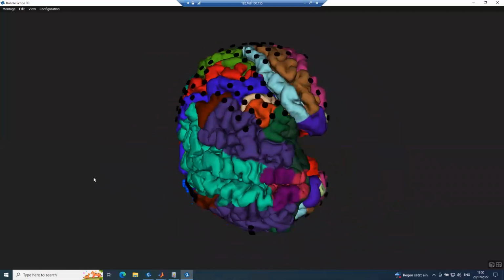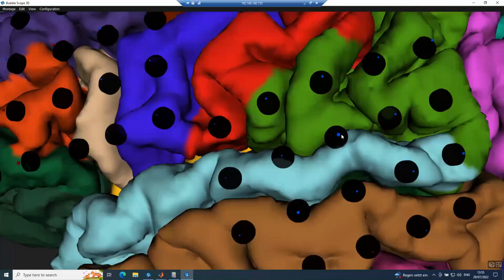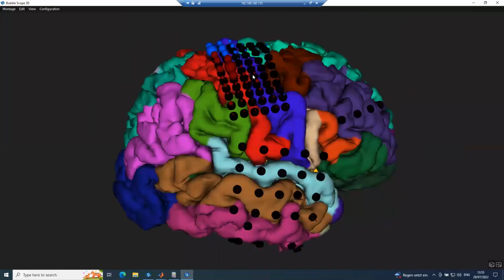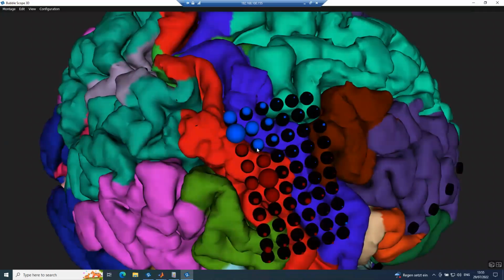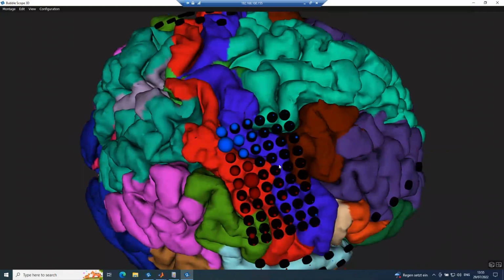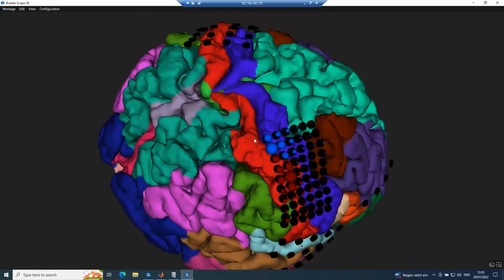And also interesting is that we do not find any bubbles, or if we find them they are rather small, on any other side. So this phase detection algorithm that we implemented is really capable of detecting just the regions that are involved in the motor sensory task for the subject while doing the median nerve stimulation.